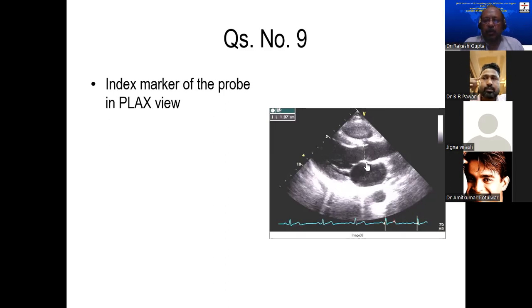And what is this structure? This is the posterior aortic root, anterior aortic root, descending aorta. Suppose we have one more structure, rounded structure over here. Yes, sir. Coronary sinus, dilated coronary sinus. Good. Reasonably fine, Jigna. Great. Good job done. Thank you, sir.